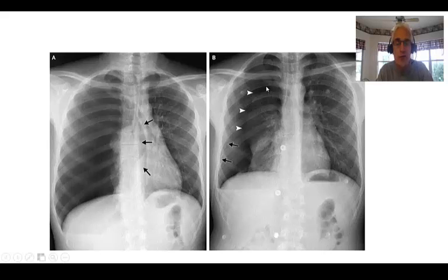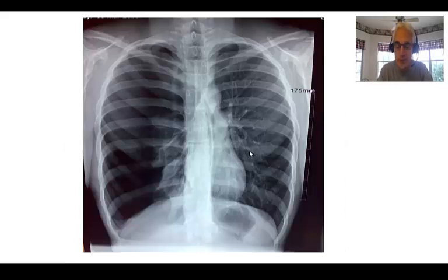This patient has a pneumothorax. The arrows show you where the lung is collapsed. So the lung, which used to be out here, is now collapsed in to this little ball. You'll have to have a chest tube placed to re-expand that lung. This is a pneumothorax. And here's another picture of a pretty amazing pneumothorax on the right side. And all you get is this little bit of lung tissue to get a chest tube in there, re-expand that lung.